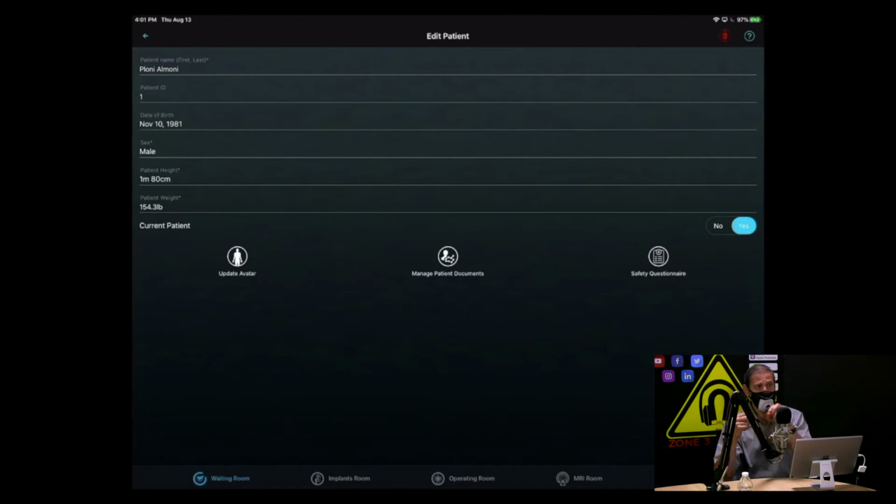And in the operating room, the patient shows up, and you can make any part of that patient transparent, invisible, translucent, or fully opaque. And you can say, it's a pacemaker. Let's grab the pacemaker, and you just drag it and drop it to the position in that patient's body to mimic what's going on in the patient the next day. So here's your patient the next day. I forgot what it was. Shrapnel in the right elbow. You grab a piece of shrapnel metal. It's labeled as metal. You drop it into the guy's right elbow.